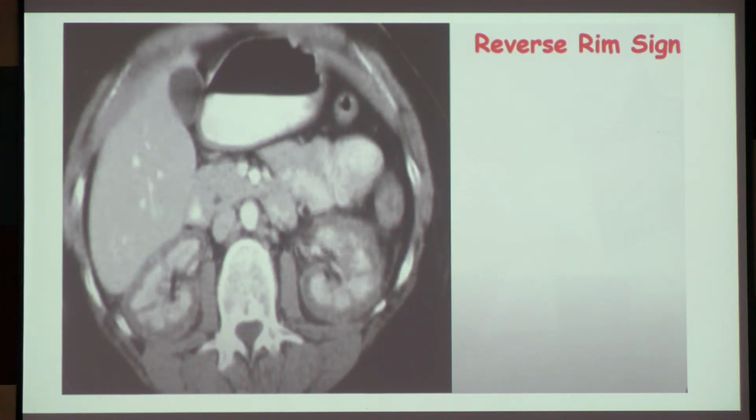This is something which was also above my knowledge when I was there. This is something which urology has taught me. Renal papillary necrosis is something which will happen at this particular level. The papillae are here. The medulla has a papilla. This papilla projects into the pelvicalyceal system, then enters the urine. So it is in the medullary part. If we are having it in the cortex part, that's not renal papillary necrosis. Okay?